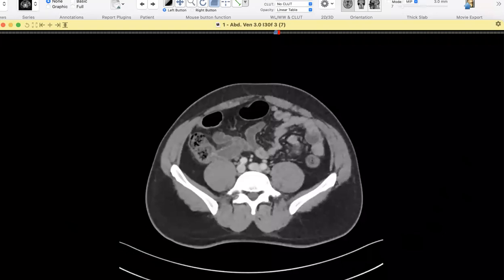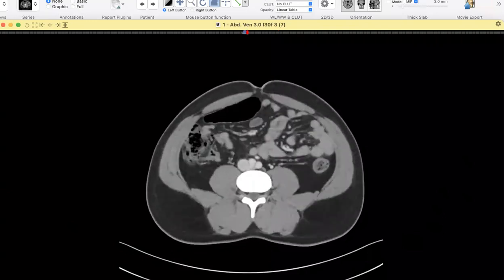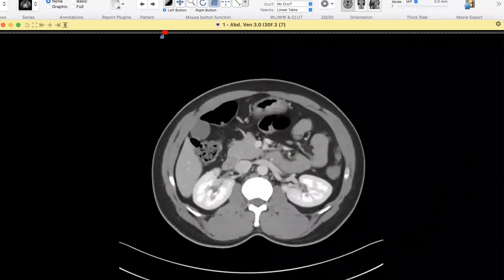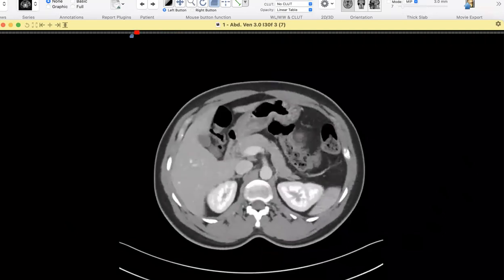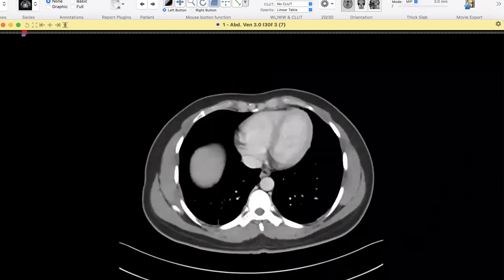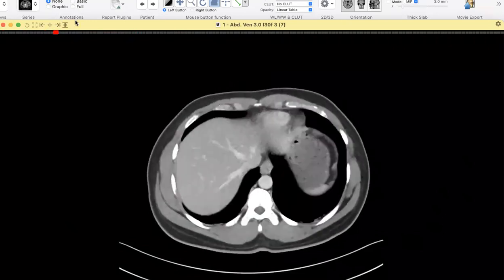Okay. And when you see a mucocele, would you be concerned for anything? Would you recheck anything? I would be worried about rupture and pseudomyxoma peritonei. However, here nothing around the liver and spleen could be detected. Okay.